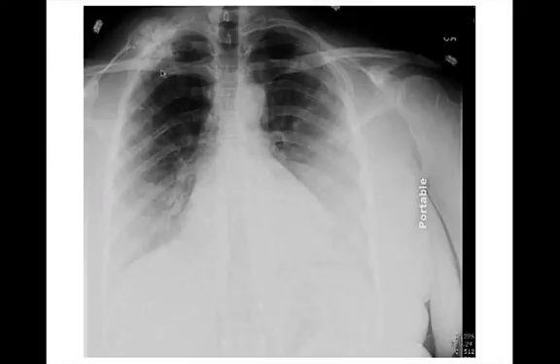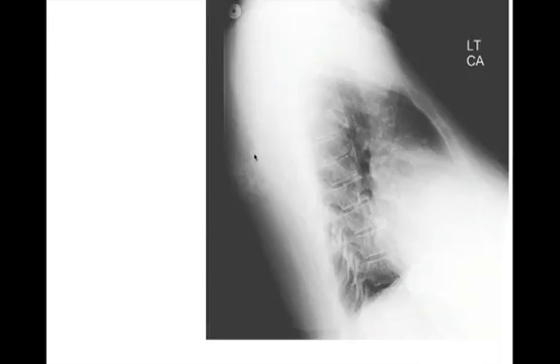So we have this, and this is kind of a corner shot, but if you look over here, the humerus is abnormal here. This is this abnormal contour right here. It did go on to further imaging. Here's the lateral view showing you this calcified mass, which looks like a stalk, pedunculated, rising from the scapula.